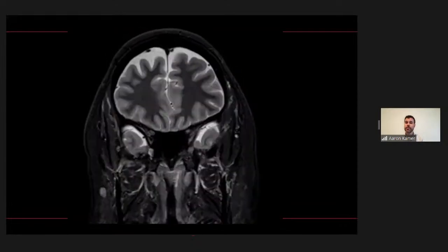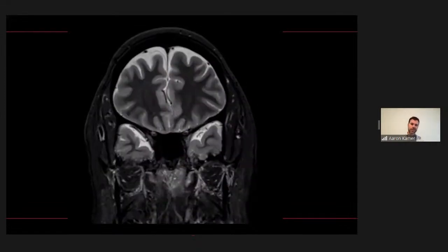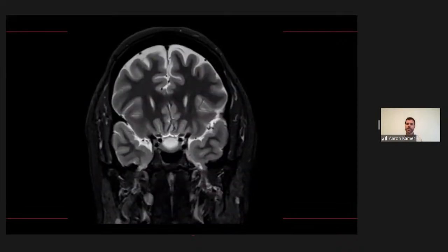And this is a weird set of cuts, right? Because I'm not showing you the hippocampus. I'm not really focusing on the optic nerves or nerve sheaths like you'd expect if you're going down the route of idiopathic intracranial hypertension, like I'm sure you've been thinking about with that empty sella. So yeah, are you noticing anything weird about the temporal lobes? This is a diagnosis, if you haven't seen much of, that definitely flies under the radar for most radiologists.